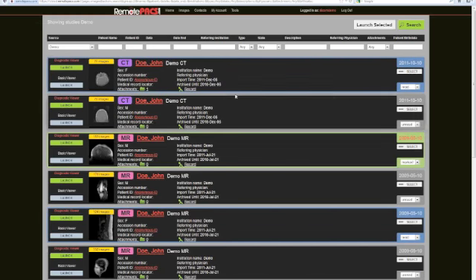So here's some demos. You can see we've got our patient name, study description, patient ID, some other critical patient demographics and study info. It's all displayed right here for people to view. So what you can do to begin with is, if you're looking for somebody specific, you can type in the name or ID, date range, depending on when the study was acquired, institution name. All of these are searchable fields up here at the top.